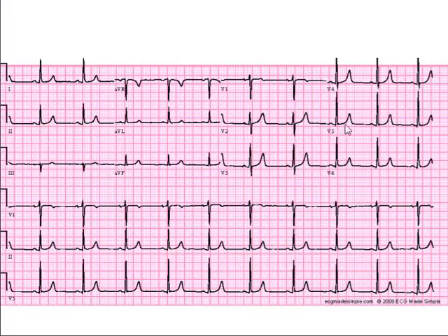Moving on to repolarization, we examine the ST segment. As you can see, here the ST segment is normal and on the baseline of the ECG. We also examine the T waves and see that they are positive in leads 1 and AVF, and also positive from V2 to V6. This is a normal pattern of repolarization.